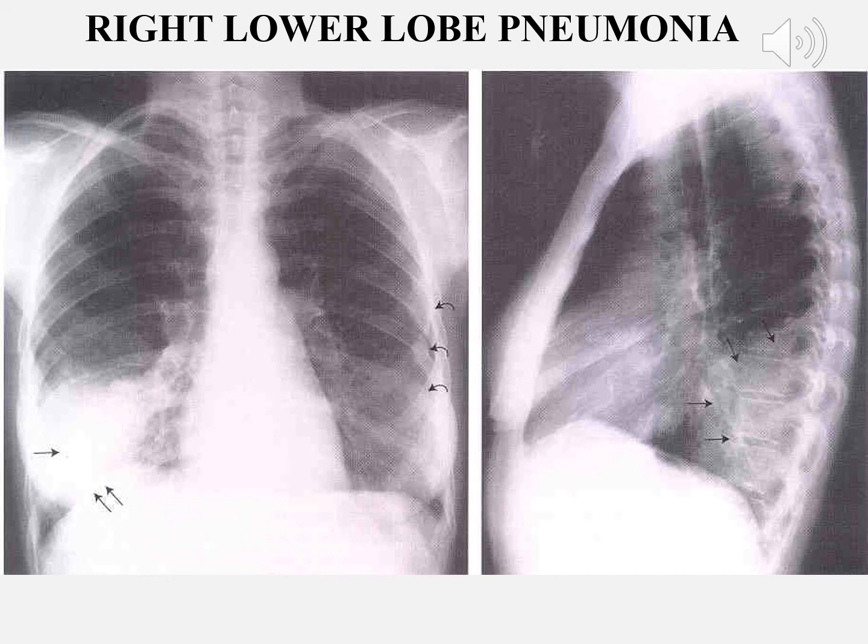Immediately behind it is the heart, but you can look at the lung spaces and tell that this patient definitely has some pneumonia there as well on the lateral view. Again, is this aligned? Looks like it is a PA view. Right lower lobe pneumonia. Look up at the airways, the trachea, the right and left main stem bronchus.